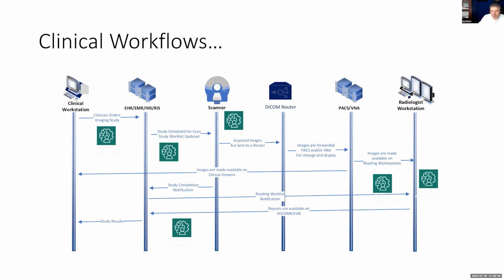And as a result of those, you might be triggering what we called a work list earlier to say, hey, can you read this image first because I have a finding here? Or you segmented some organs, just like the previous example, to speed up the next steps for another algorithm or the physician themselves. It's segmented, volumes are calculated, whatnot.